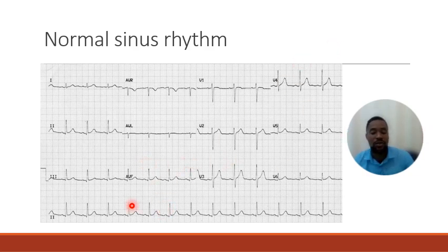What you get, you write it down. The same way, if you are using big boxes, just say 1, 2, 3. 3 big boxes, but there are 3 small boxes left. So what do you do with the 3 small boxes left? You say, okay, the 3 boxes is 0.6, because one small box will be 0.2, 2 will be 0.4, 3 is 0.6, then 0.8, then 1.